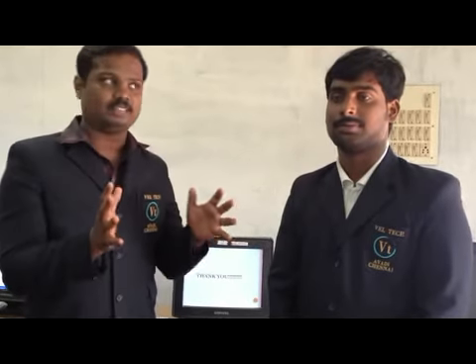Dear friends, we have come to the end of the presentation, and this is the time to conclude. Let me give a short review of what we are going to do in the future. The future scope of this project is the detection of microaneurysms, hemorrhages, etc. We are going to design a diagnostic system, and we are going to give it to the public for public service.